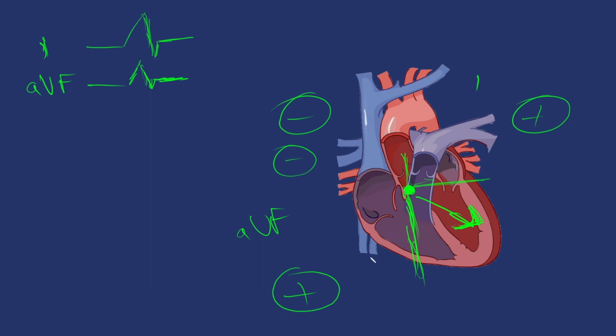All right. So what we're doing in this one, talking about cardiac axis and why it matters, is we're breaking up the heart into 4 quadrants. So what we're going to do is just break it up this way, 4 quadrants.